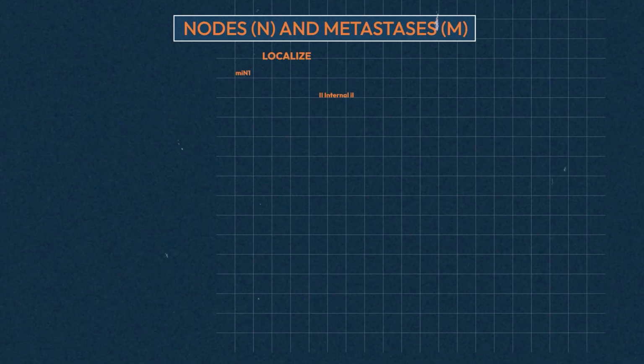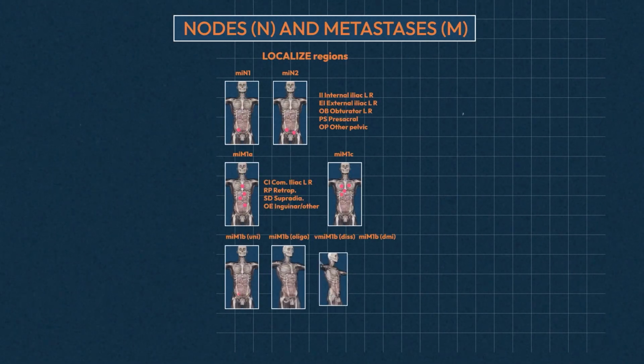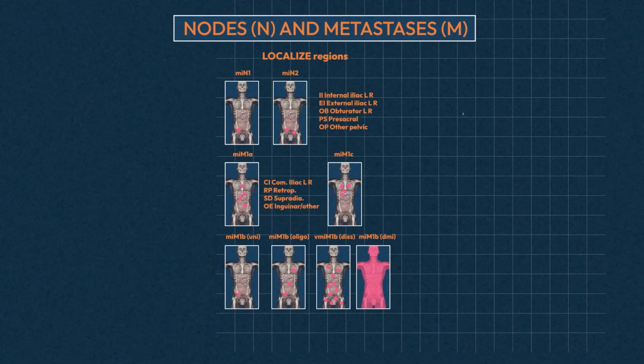And primarily here you're dealing with something called a PSMA expression score, where you look at uptake of lesions and then compare them to normal anatomic structures, or uptake or intensity of PSMA PET in physiological structures such as the blood pool, the liver, and the parotid. And then a PSMA expression score is assigned based on where a lesion lies in relation to those other organs.